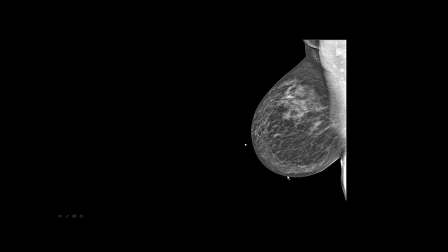So yes, I know that you can window and level to be able to see the nipple, but here they can't see it. So as you see, the bottom of the breast is pretty horizontal, not bad. But when you go up into the IMF, you can see it goes up and down. They don't like that.